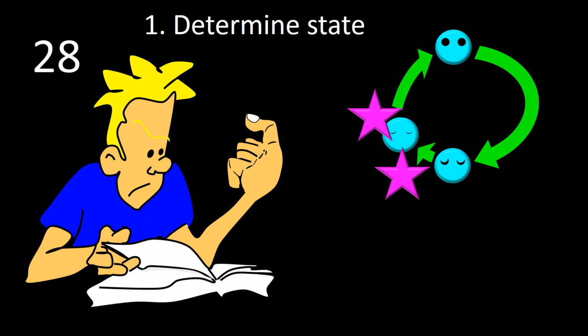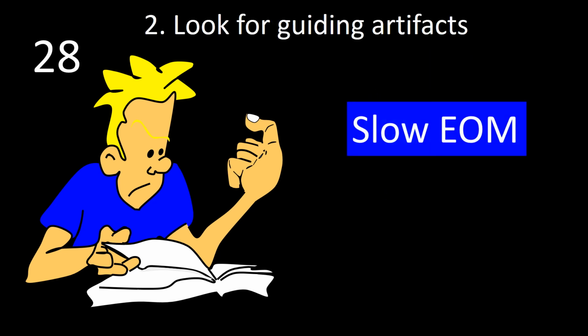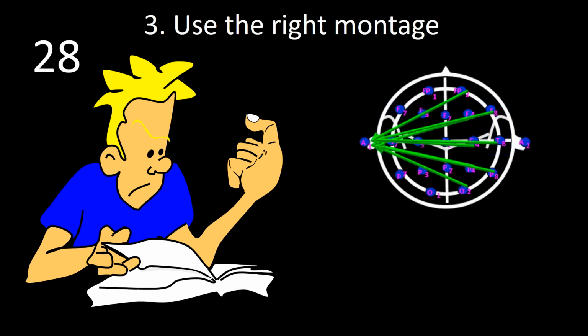They occur during drowsiness or early sleep. They may occur simultaneous with eye movements when they occur during drowsiness. They are best seen by using contralateral ear reference montage.